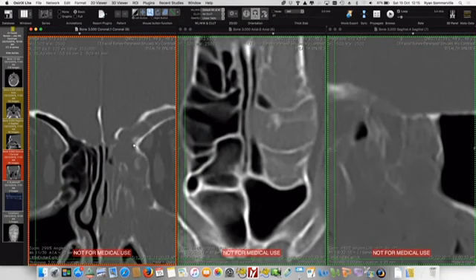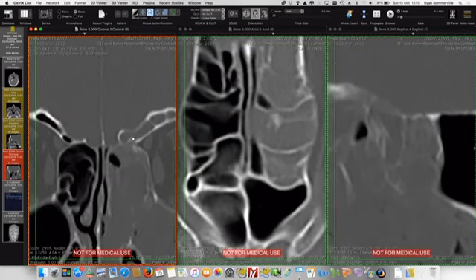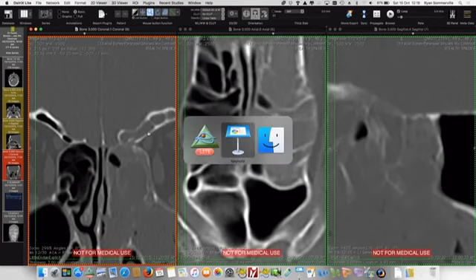sclerosis just above the anterior ethmoidal artery, sclerosis. And so this was an inverting papilloma. And so what we did then was we did a staged procedure, second stage. I took the anterior ethmoidal artery as it came out of the orbit, resected all of that stuff there, and he continues to be free of disease. So as Jenny said, if I was able to get the base or knew the base was there on the first instance, then I'm able to control his disease.